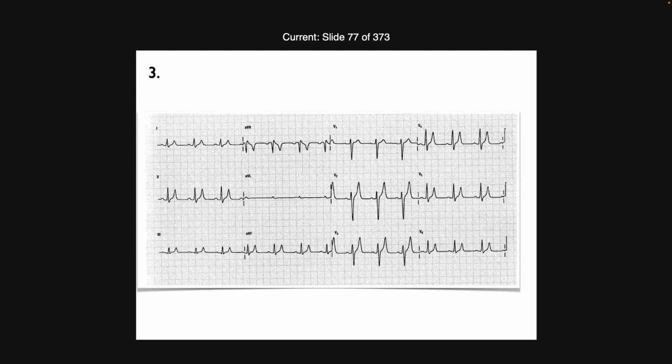And interestingly, T waves are always easier to see in the V leads because they're larger. But look at the limb leads. Even though these aren't really all that large, look how pointy they are. So these also are considered hyperkalemia T waves.